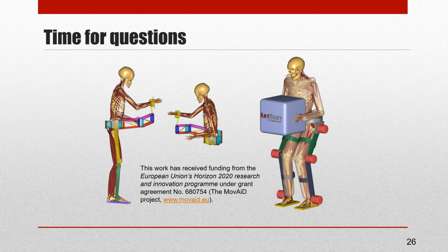There are also some other ways that you can do it. Let's say you have an end effector like a hand that you want to go through a certain path. Then you can define an interpolation driver which would be a sequence of points that the hand would have to reach. And when you add that as a driver to the model, then that's what the hand is going to do, because the existing drivers in the standing model, for instance, are soft drivers. So you don't have to disable those. When you specify that the hand has to go through a certain sequence of postures, then all of the other constraints or drivers in the model will accommodate the hand doing this, because all of the other constraints are soft constraints. So they will be compliant with whatever you specify in addition to themselves.